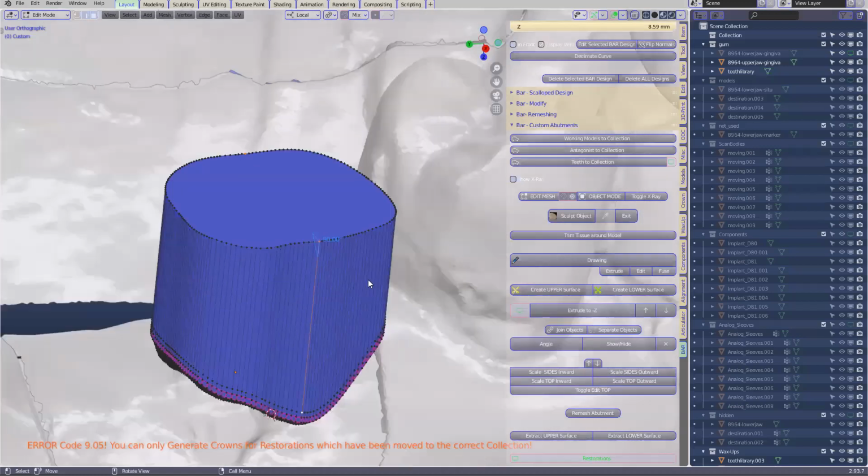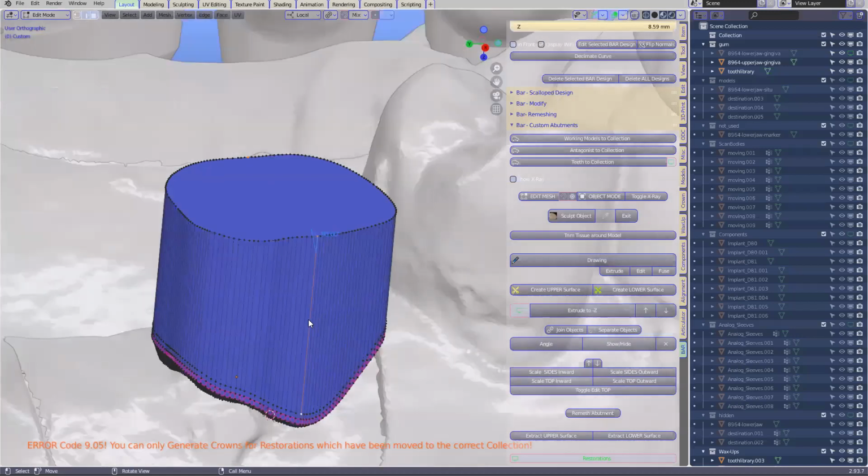So you did that by selecting certain vertices. Is that correct? Yeah. So we've got 1, 2, and then followed a line to 3, parallel to the surface at the moment. Exactly. Also note that you will see the pink. The pink is the outline of where we've cut it. That is the margin.